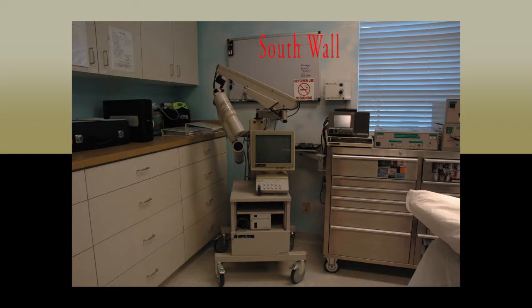Along the south wall of the operating room is located the fluoroscan. This is a mobile X-ray unit used to ensure proper fixation has occurred in surgery. For detailed instructions on the use of this machine, see your trainer.